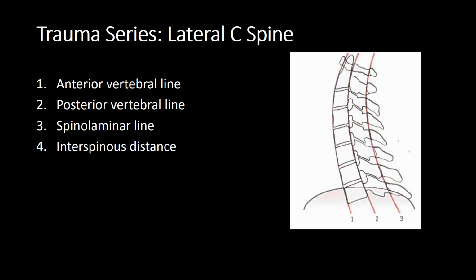A better thing to assess for is the interspinous distance. The interspinous distance is the space between two spinous processes. Diastasis of the interspinous distance can indicate ligamentous disruption or fracture.